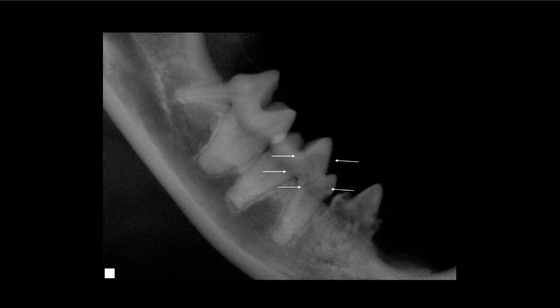And so there's that area outlined that I'm talking about. So what we would do is, again, turn that patient over. We're going to look at it like we would be looking at it surgically, with the crowns facing us.